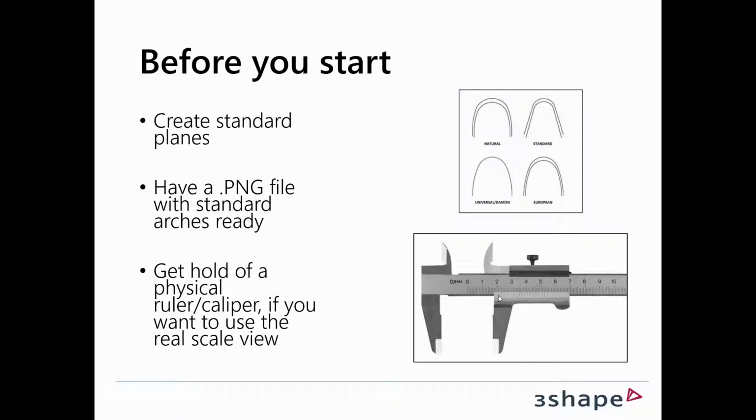But before you start, you should create the standard planes, and we have a separate video on that. You should have a PNG file ready with the standard arches. You'll see that later on. And you should also get hold of a physical ruler or caliper if you want to use the real scale view. But let's go into AutoAnalyzer and see how the dental arch analysis works.